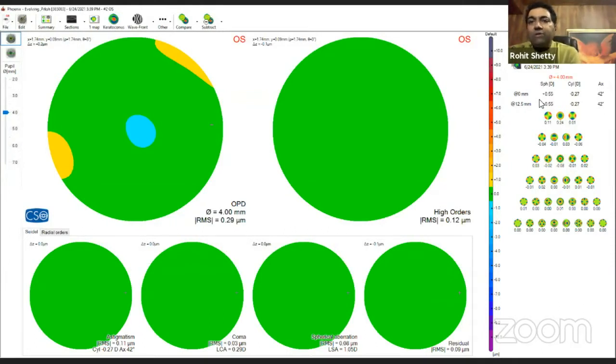In this case, it's not so manifest, but there are times when we have had close to a diopter of cylinder from the epithelium itself. And it also gives you the epithelial Zernike maps, which is a complete epithelial Zernike map, useful for understanding how good or bad the quality of vision is driven by the epithelium itself.